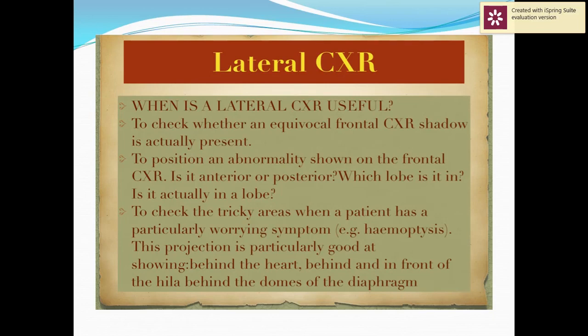Always in people who have foreign body inhalation, like hairpin inhalation, to check either the position of the foreign body. Sometimes in patients with hemoptysis, the projection is particularly good for behind the heart. Sometimes in people who have lung cancer or a hidden area in the hilum, it will also help us localize the pathology, either it is anterior mediastinum or middle or posterior mediastinum.